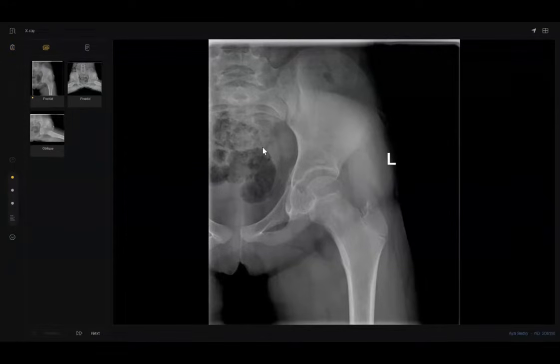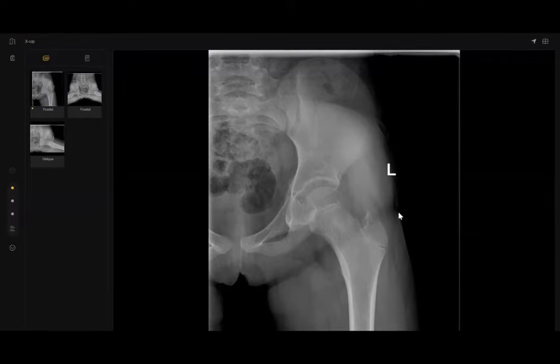Okay, I have been provided with a radiograph of the pelvis, left side, AP view. I can see that there is a lucent area along the medial aspect of the femoral epiphysis with a sclerotic line along the medial femoral head. I can also see minimal irregularity at the trochanteric region on the greater trochanter. The rest of the pelvic bones appear normal, and the left SI joint appears normal.